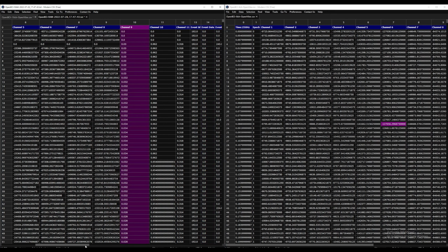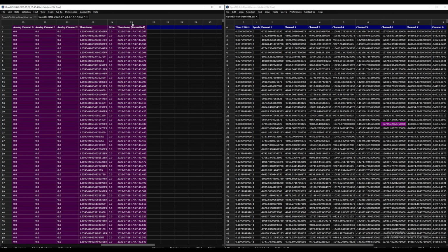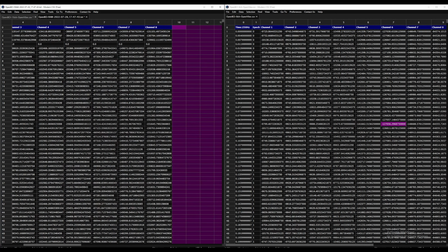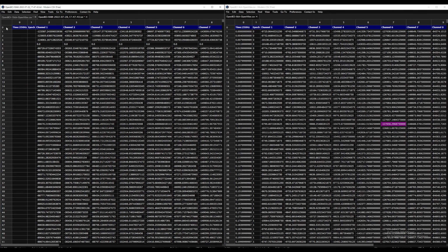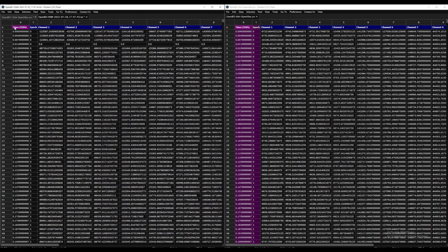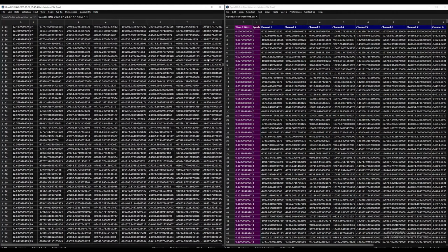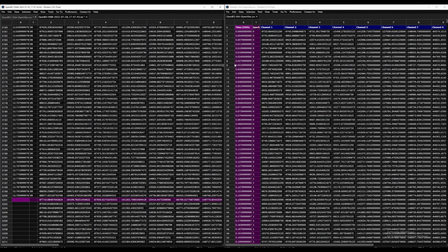We don't even need the accelerometer channels for our purposes today. So we can just get rid of these columns. Let me copy the time and epoch columns. There we go. So it wouldn't reach all the way to the end because it's a much shorter recording, but it'll do.